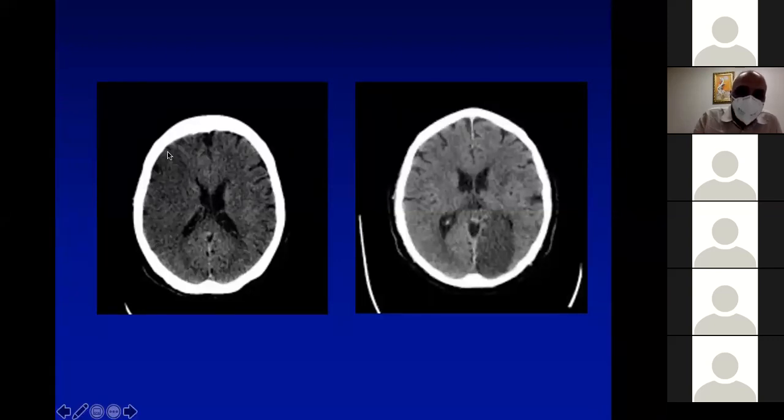You can't identify them, they are edematous, and you can see a faint wedge-shaped area in the region of the middle cerebral artery, which appears darker than the remaining brain parenchyma. So this is an acute ischemic stroke in the territory of the right middle cerebral artery.